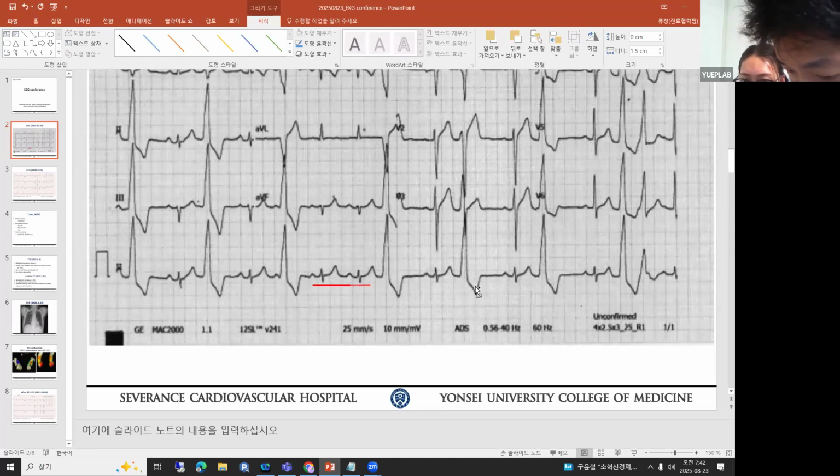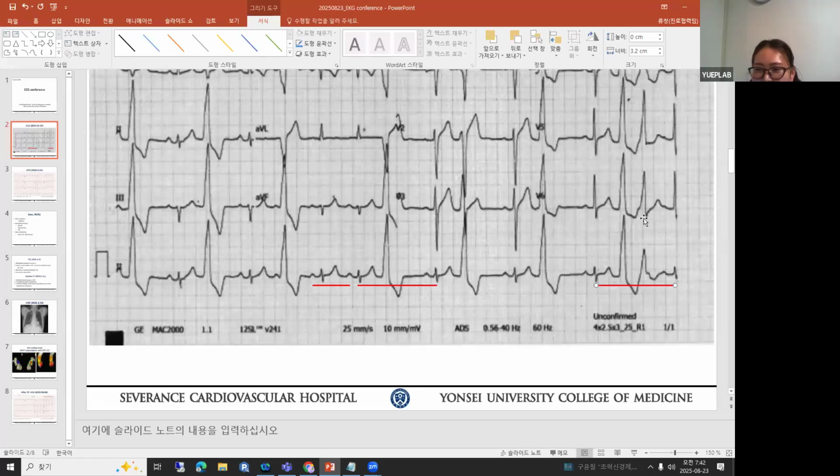Okay. That to the next one. No, you've got it so long. You've got to cover the whole thing. Measure the whole thing. Long. Yeah. Keep coming. Yes, there you go. How about measuring the RR interval? No, the last one. Yes. What is it? See? No, it fell into the same coupling. Yes, right. So if you look at the PP interval, this is a sinus beat. Yeah, I agree with you.